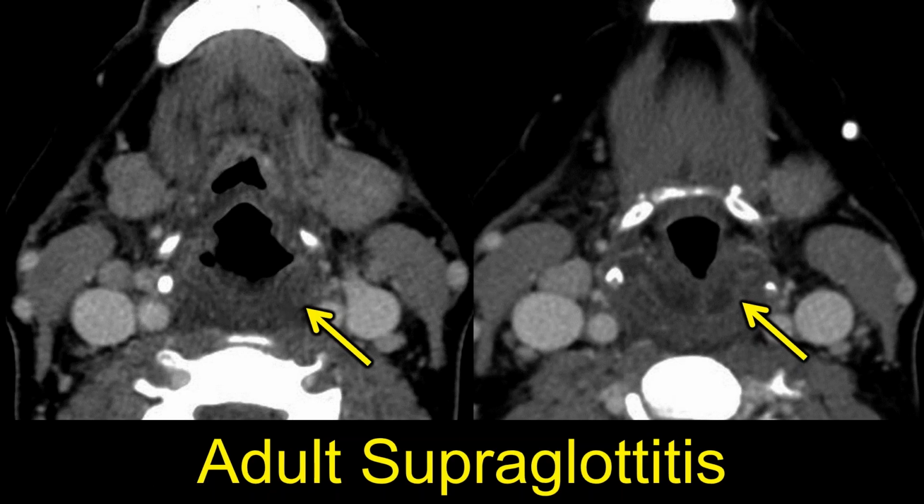So I can look at the imaging and think about what the modality is. This is a CT scanner, so it's just a big, stupid densometer. I'm looking at densities of stuff, and I can see that the density of the stuff is low. It's more like fluid, closer to fat than it is to muscle. We see the submandibular glands on both sides, and we see the SCM, the sternocleidomastoid muscles, on both sides.